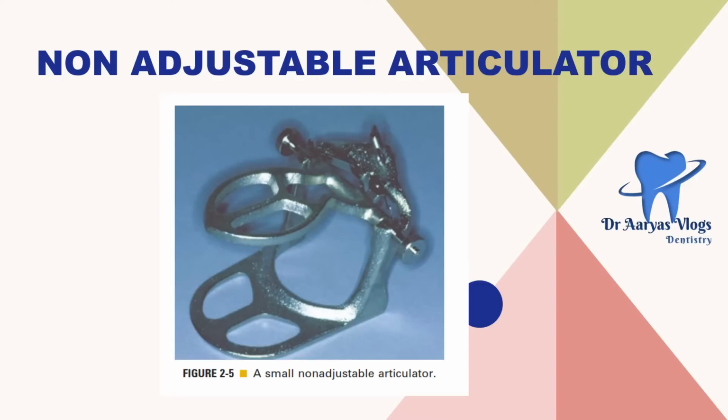Coming to the non-adjustable articulator, most restorations made on this type of articulator often lead to various occlusal discrepancies, because these instruments do not have the capacity to reproduce the full range of mandibular movements. Only vertical motion is possible through these articulators.